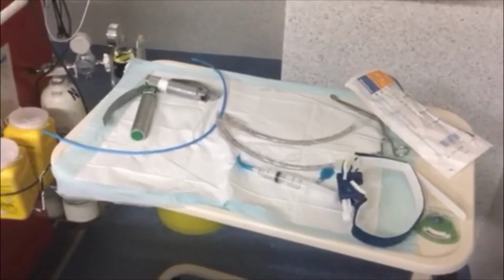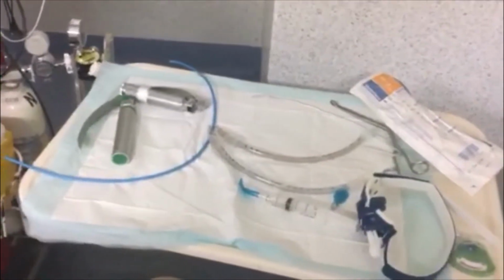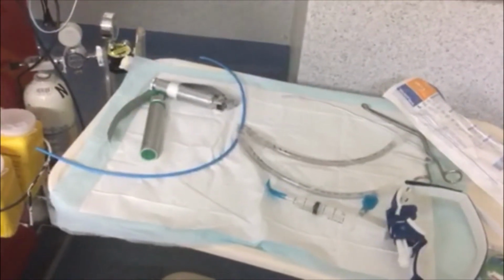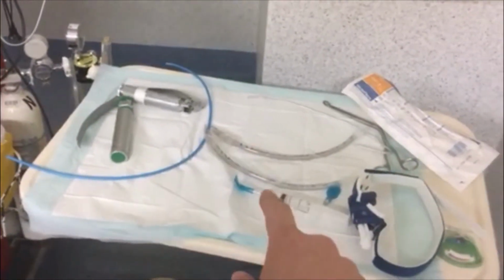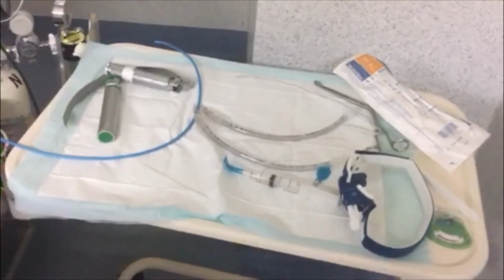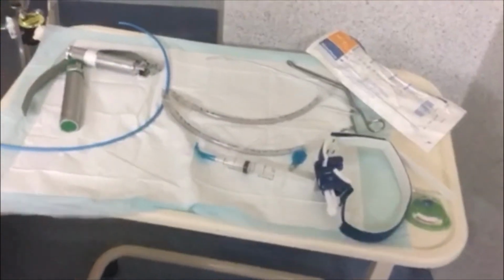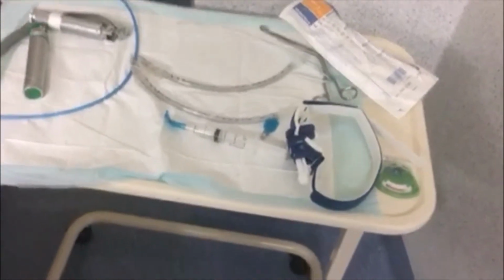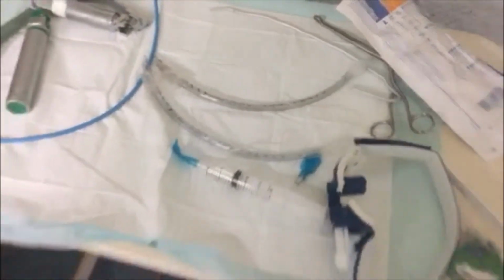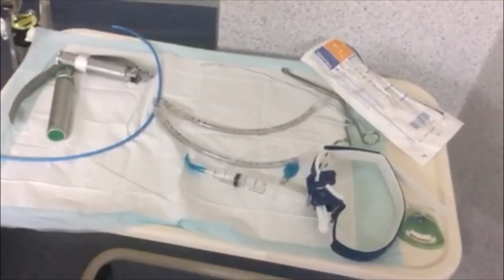Now, our equipment that we need, so heading over to our airway stuff. So over here we've got two laryngoscopes, one just in case the light doesn't work, and size 4 on that. We've got our bougie over here, and we've got two ETTs. One should be slightly smaller, so a size 8 and a size 7, or if your service does half sizes, even better. Unfortunately, I've only just got two size 7s. That's all I could find in the expired stock, and there should be a 10 mL syringe.